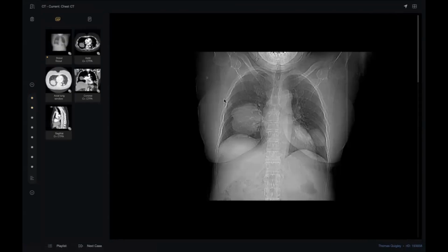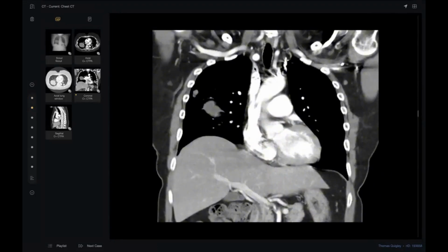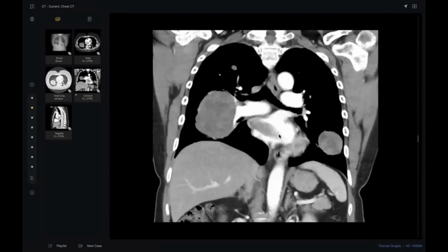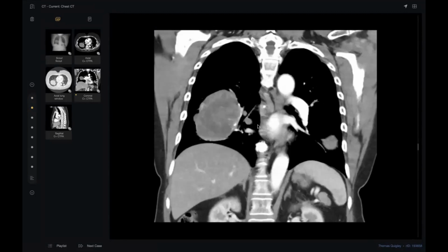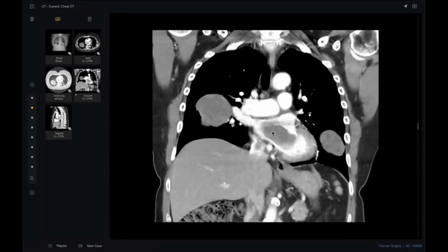Then here, this is the CT. You did very well when you picked up this embolism or thrombus, whatever, here. And if you remark, it is connected, look here, it's connected with the tumor. Yes, tumor connected. And it has some enhancement here. So it is a malignant thrombosis, causing showering to the brain. Thank you, doctor, so much.